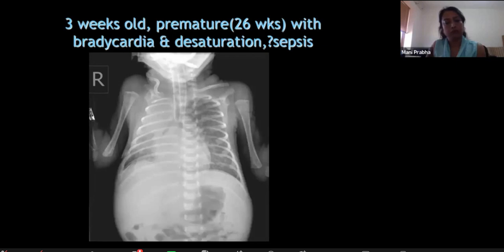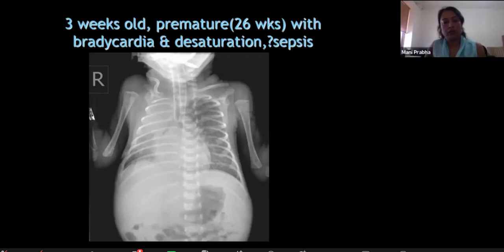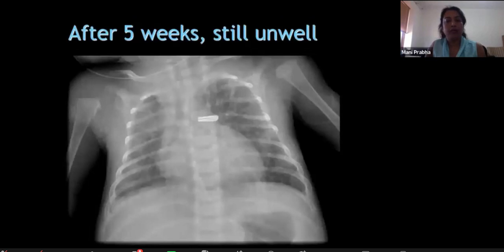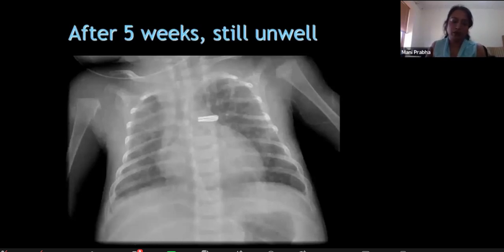Is there any hyperlucency? No, sorry, I can't. Okay, no worries. The problem still remained, and when the patient was 5 weeks, still unwell. And now, can you make out what's going on before I take over?